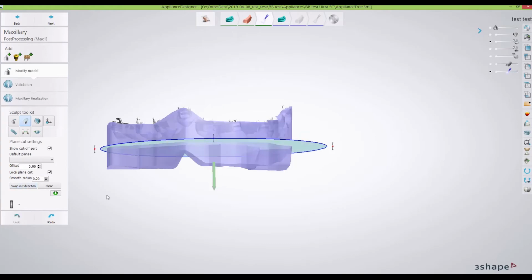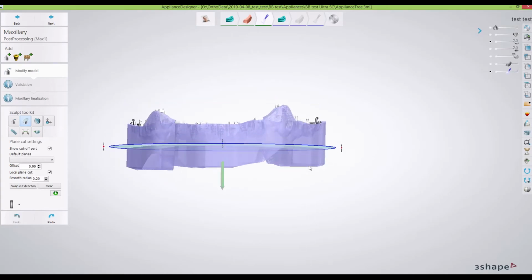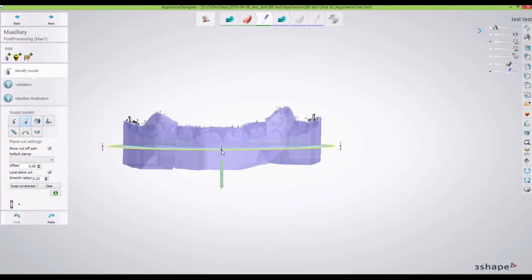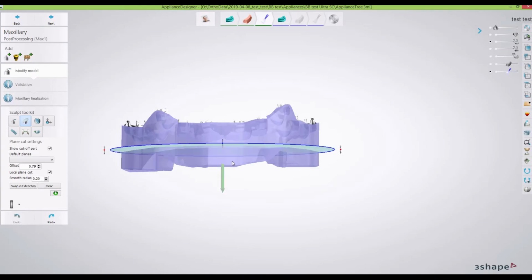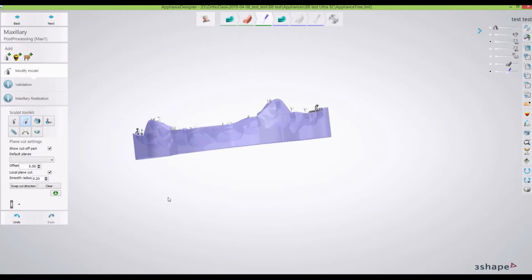And then I'm going to swap direction. I might be a little bit close on those incisors, so I'm going to move it down just a hair. If you wanted to move the whole thing up or down, you could toggle from here. When you see the whole ring blue, we'll see it move downward. And then let's remember to hit apply. A lot of times I'll forget, but if you hit apply, it's going to show you what it looks like. If you don't like it, like I was doing, you just keep on doing it till you get what you want. And that looks pretty good there.